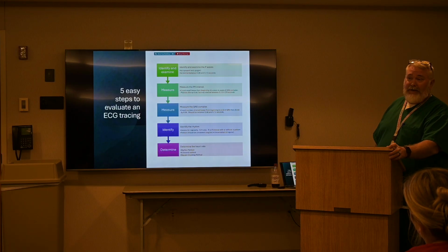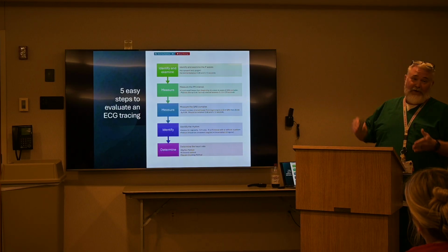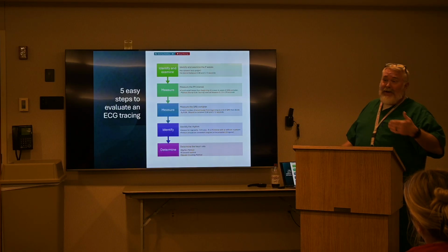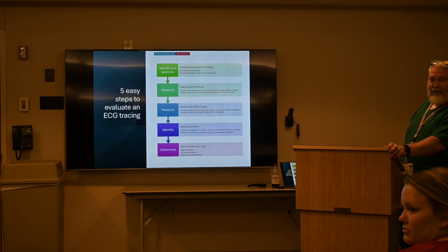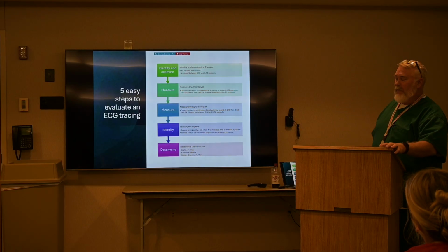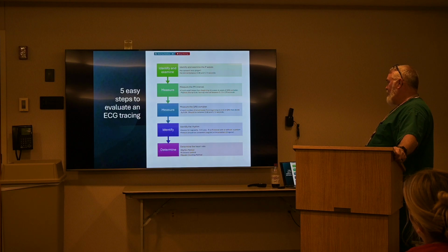That's how I've always done it, but from a definition, you're supposed to measure to the peak of the R wave. It should be the PR interval. Realistically, I just do the PQ, honestly, because it doesn't change much. Me too, same here. And then after you measure the PR, measure the QRS complex.